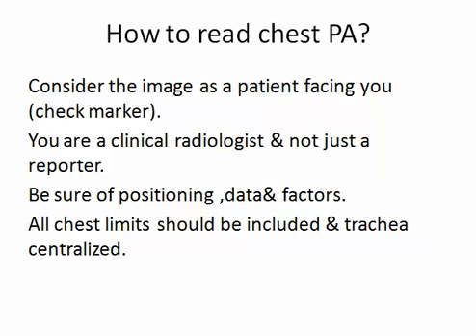How to read a chest X-ray? Consider the image as a patient facing you and check the marker, because this is essential. You find right and left. Patient facing you means his right is opposite to your left side. You are a clinical radiologist and not just a reporter.